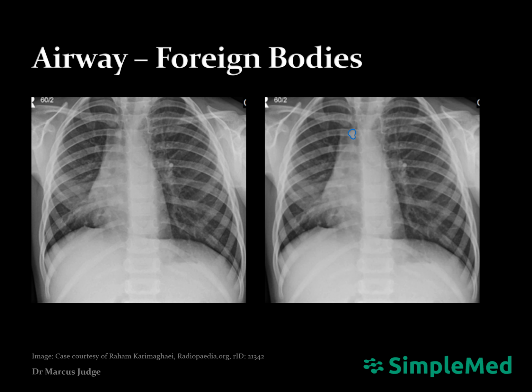Aspirated foreign bodies have a predilection for the right tracheobronchial tree, given the wider and steeper structure of the right main bronchus. The radiographs show a peanut inhalation, causing a lung collapse in the right middle lobe. Spotting these signs can be very technically challenging. The peanut is highlighted in blue.